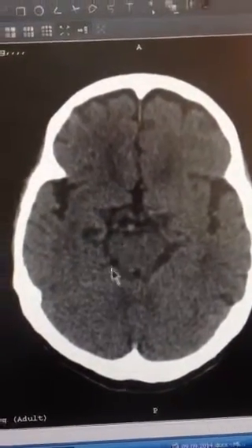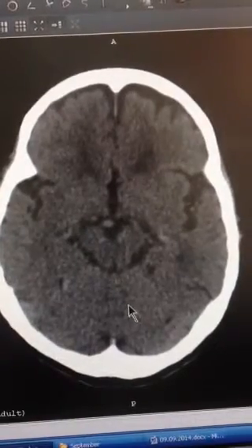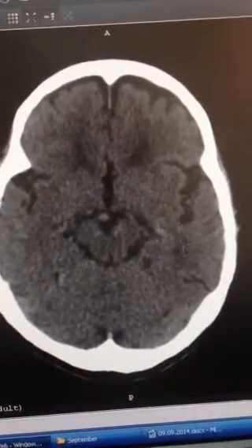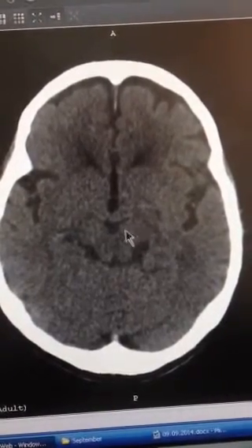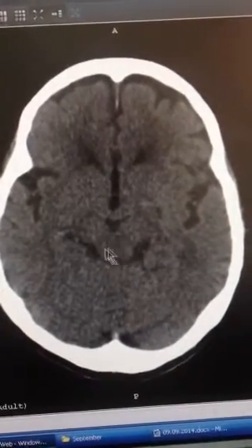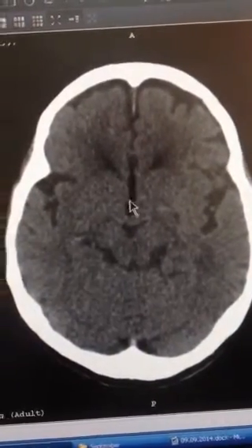You see this is the midbrain, lower part, where you can see the small cavity. This is the aqueduct of Sylvius. Cerebellum, you are still seeing some part of the cerebellum. So this is frontal lobe, this is temporal lobe. As long as you are seeing the Sylvian fissure, it's still the temporal lobe. So you see here, this is brainstem. This is the crus cerebri of the midbrain, and these two projections are part of the corpora quadrigemina, or the colliculi. This must be the inferior colliculi, and this is the third ventricle.